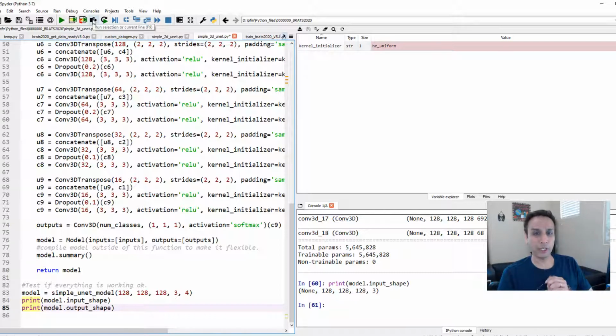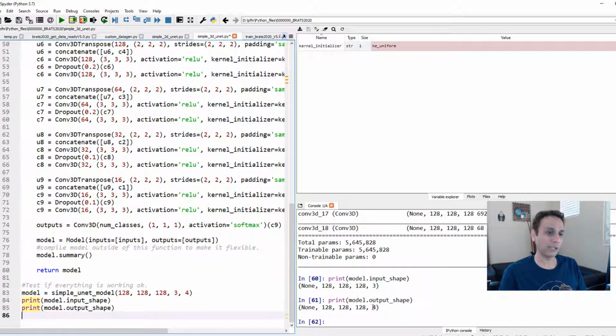When you import external libraries, I tried to find something on GitHub, and I found something that said 3D UNet. But when I printed this out, it just gave me 128, 128 by 3. That's it. No Z dimension. So anyway, I thought it's easier for me to just do my own thing, so I have full control. So this is the input, and the output should be exactly that, except 4 channels, right? 4 channels because we have 4 classes, and then we'll do argmax to convert that into our classification at a given pixel. So this is my 3D UNet. So we have our 3D UNet ready.